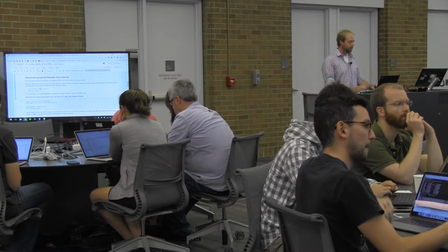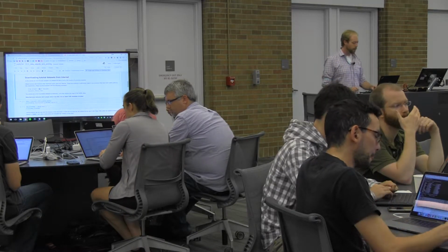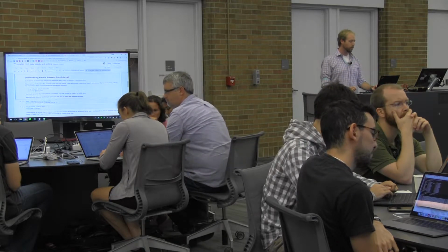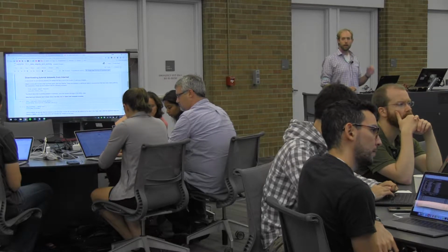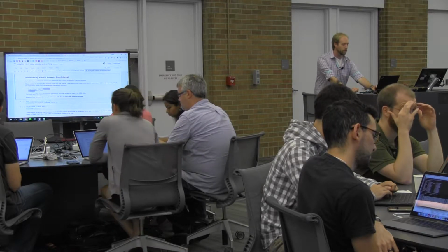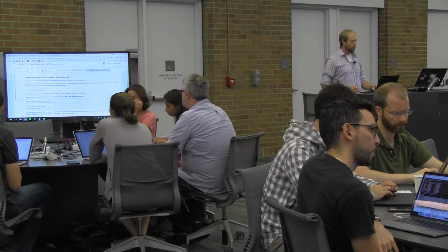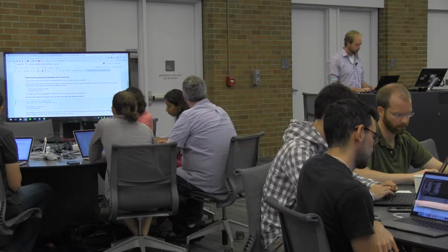And so you'll notice that in nilearn, which is a totally separate package from Scikit-Learn, they've adopted the same structure of having a datasets module and then having a number of functions that begin with fetch underscore. And then you can grab different, in this case, neuroimaging data sets that way. So that's what we're going to use to go through some of these analyses here. I'm not going to go through all of them, but if you just hit tab after you type fetch underscore, it should give you a list of the stuff that's there.